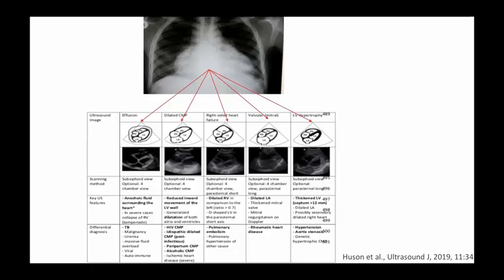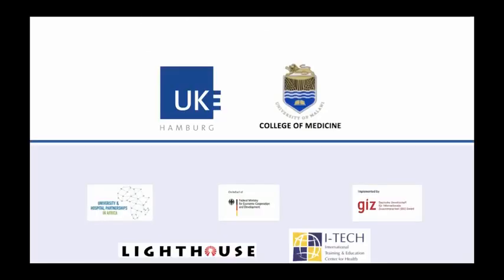Or is the left atrium bigger than the left ventricle, pointing to rheumatic heart disease? Or, as we saw at the end, is the left ventricle very muscular, and is it a case of hypertrophic heart disease? And with this, I think we are at the end.